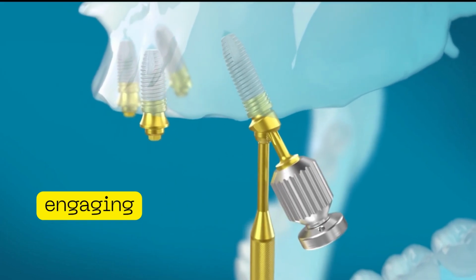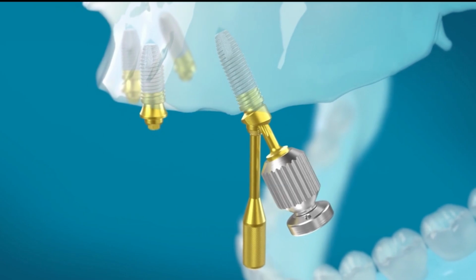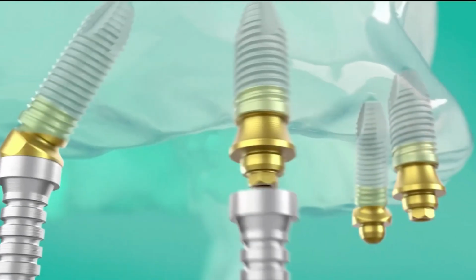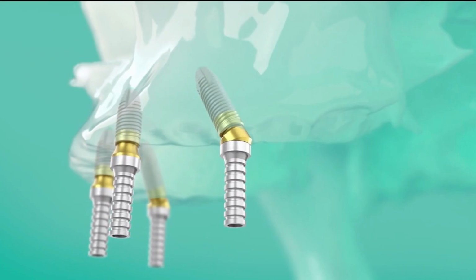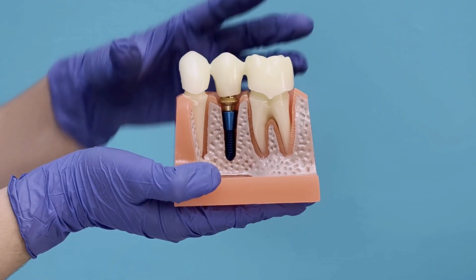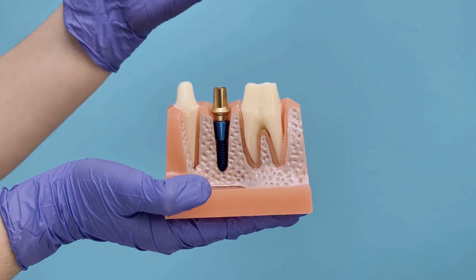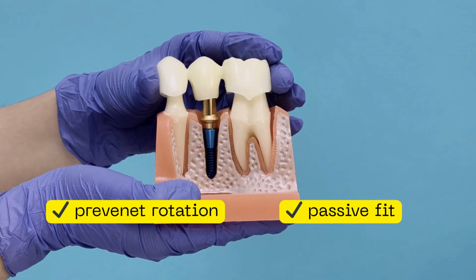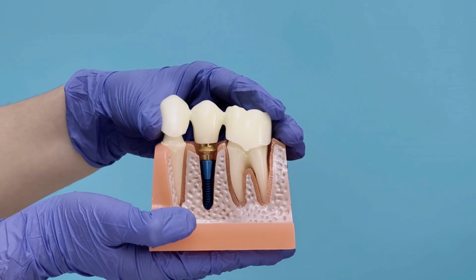Interestingly, angled multi-units are still engaging to the implant itself. The implant-level connection needs to be indexed precisely so the angle correction occurs in the intended direction. However, the restorative connection above the MUA remains non-engaging to allow passive seating of the final prosthesis. So ultimately, implant abutment connections are always balancing two competing goals: prevent rotation, while still allowing passive fit. And understanding when each goal becomes more important is really the key to understanding implant restorative design.